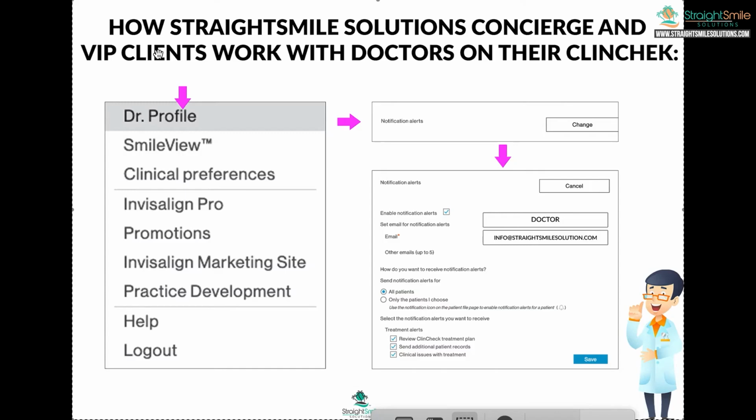So here's how you can go ahead, and this is kind of a new workflow. Before, you had to make a distribution email. Now they let you have another notification. You can either create a staff account for us, which is a great thing, or you can give us your doctor login, whatever works for you. I don't really care because we're not going to look at your finances or anything else. All we're looking at is the Clincheck, optimizing it, and we're never approving it.